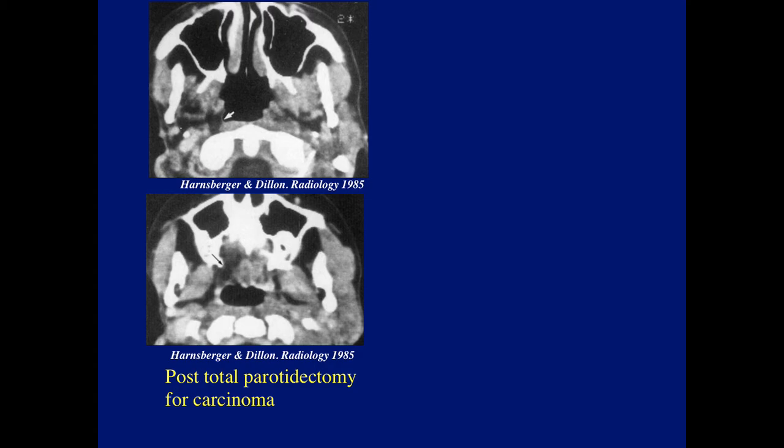Fat we can all recognize. What structures are involved? Correct, as Nate said. This is denervation atrophy, or fatty replacement. This is the soft palate.